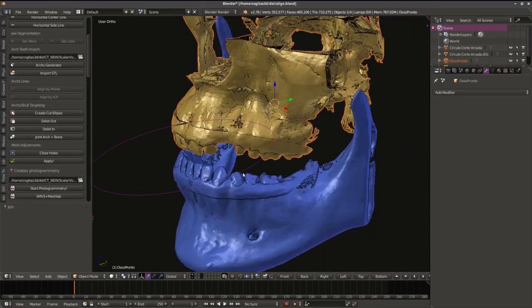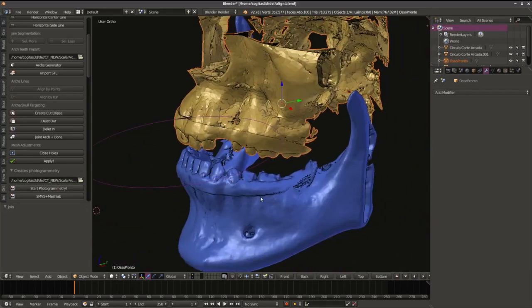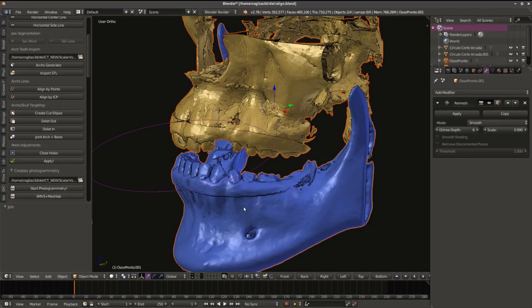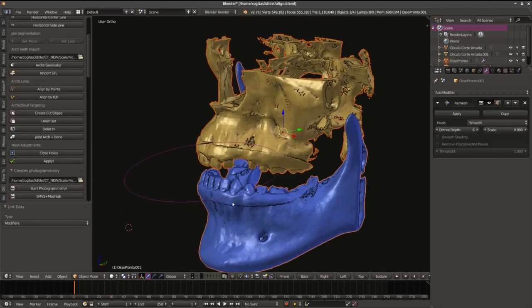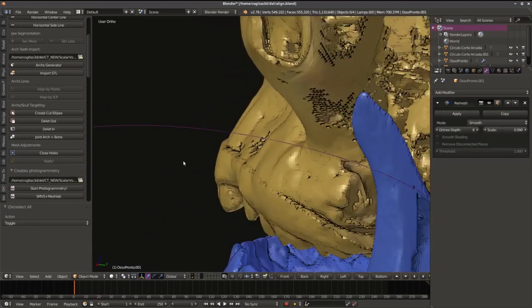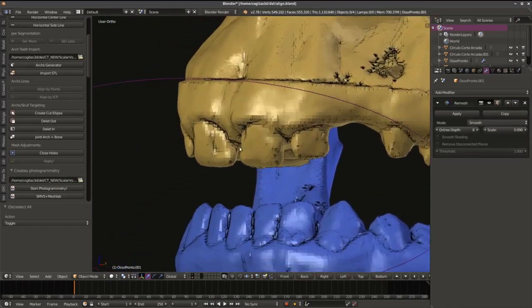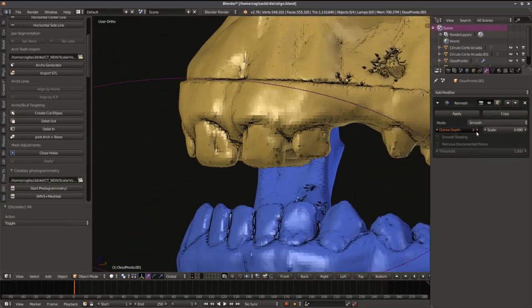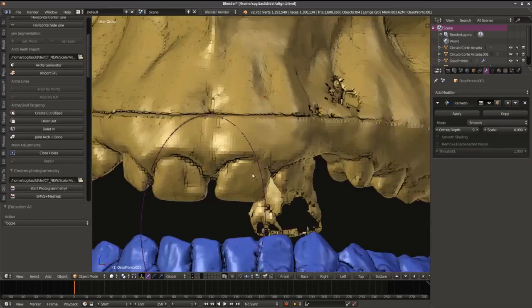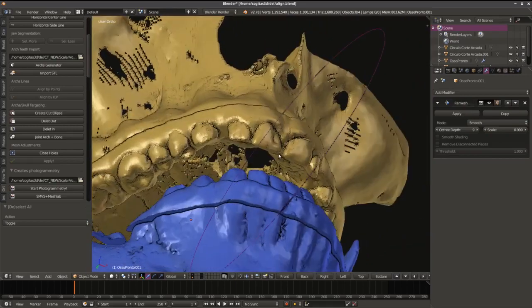Okay, my friend, you can do the same thing in the upper part. Ctrl J, and attribute. You can do an interesting thing. You can select the lower part, Ctrl L, and select the modifiers, and the lower modifiers will be transferred to the upper part. You have the closed holes in the upper part too. If you think the resolution is not good, you can increase the value here to 9. I'm doing it now. It can lag a little. Look, it's not so slow. It's already done. You can increase the value until the quality you want.